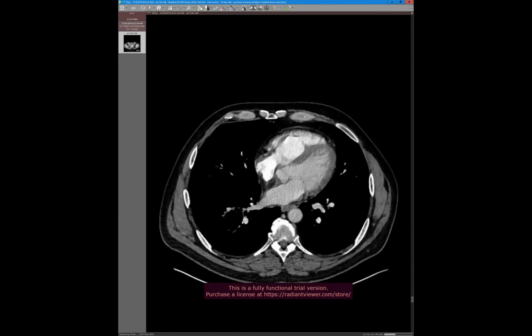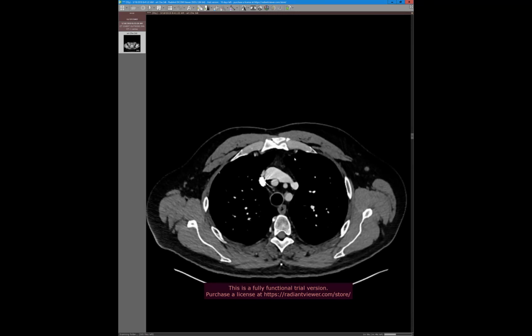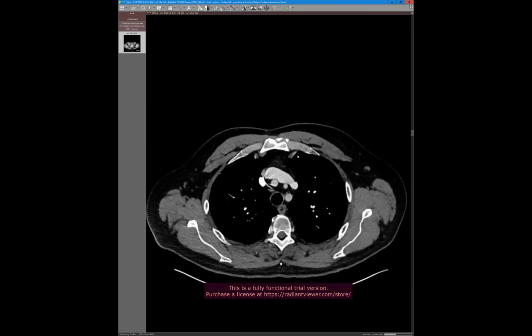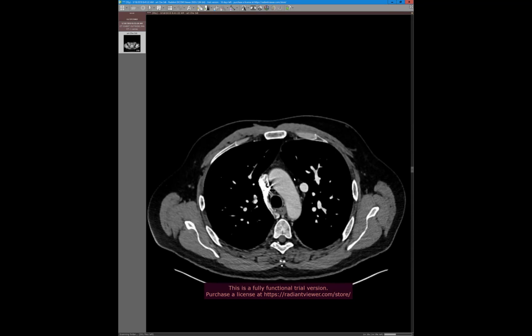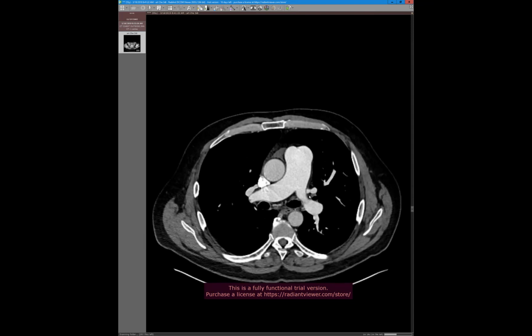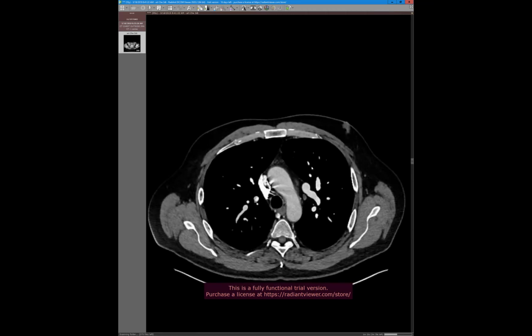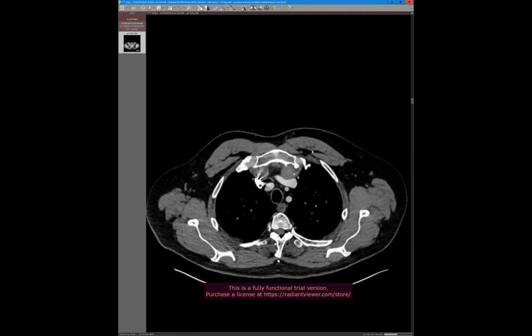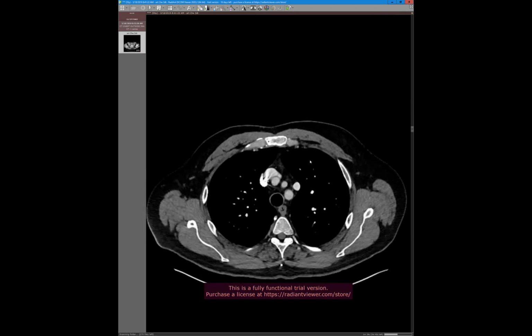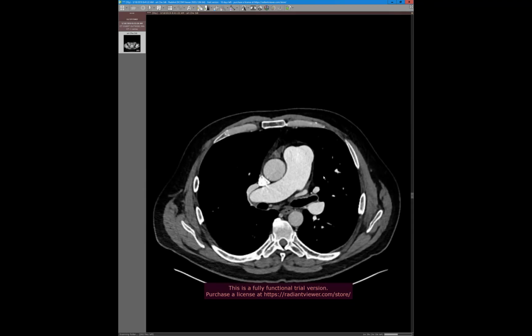So you can see vessels go away and there's clot. So look at this PAPVR, okay? So we have PAPVR, left superior pulmonary vein draining anomalously. We've all seen that. What I haven't seen is where this vein also connects to the left atrium. So this PAPVR has dual connection to the anomalous systemic venous drainage, but also its normal pulmonary venous drainage.